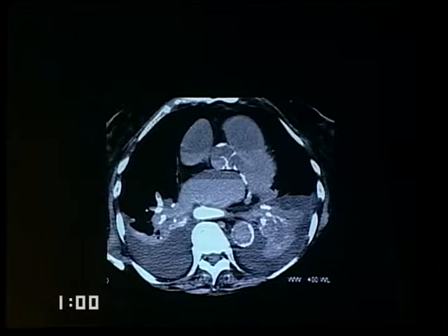An extreme example of slow circulation time, which hopefully you won't encounter very often. We've got contrast fluid levels in the heart. This, of course, is a patient who arrested in the scanner. There's no cardiac motion, so of course we're seeing the separation of the contrast in the blood.